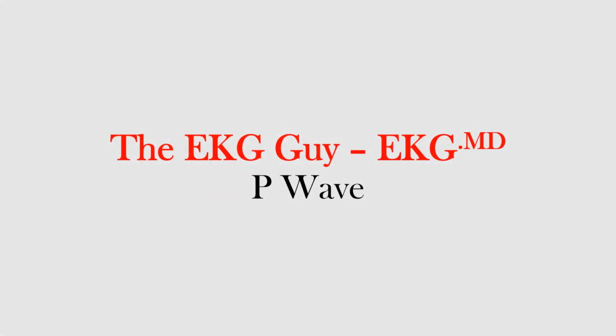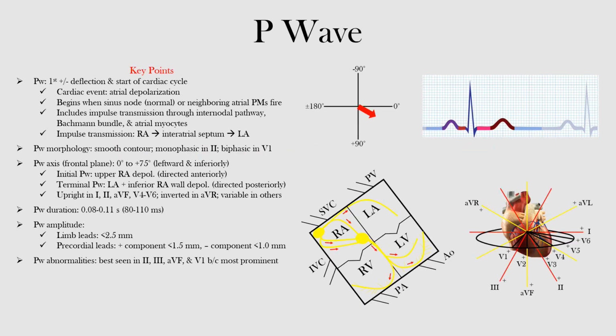In this lecture, we will discuss the P wave, specifically what it represents and how it should normally appear on the EKG. The P wave represents the first positive or negative deflection in the start of the cardiac cycle. If you look here, we have our P wave situated here, okay? The beginning of our cardiac cycle, right here, is where our P wave is. It represents atrial depolarization and begins when the sinus node or neighboring atrial pacemakers fire.